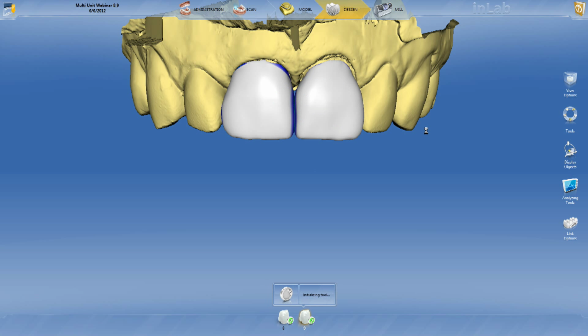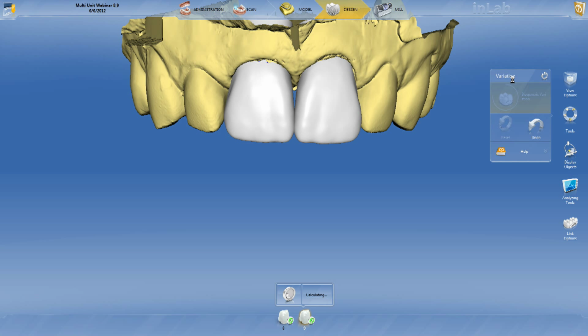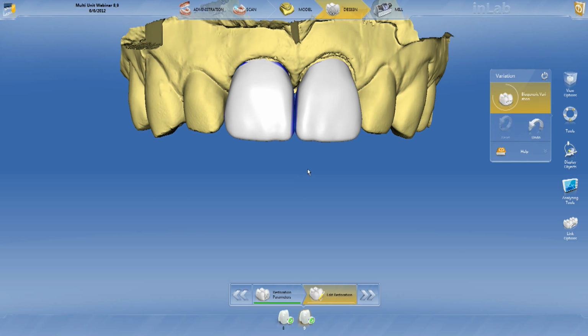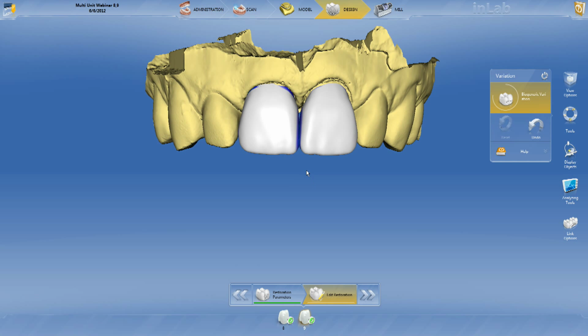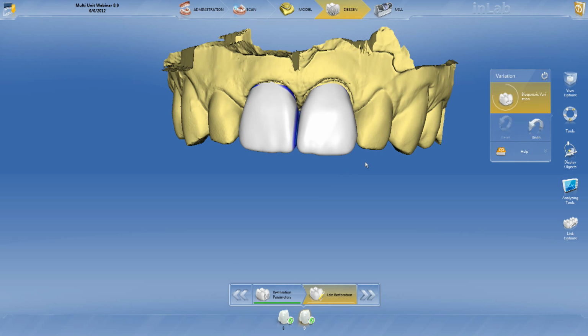Now, biovariation. I use this tool a lot sometimes, depending on if I want to change the way it looks a little bit, add some flavor. And then of course you start knowing the numbers and where you want them. You got number 78. Okay, so as you can see, they both changed. Okay, so that's pretty cool. Look at that.